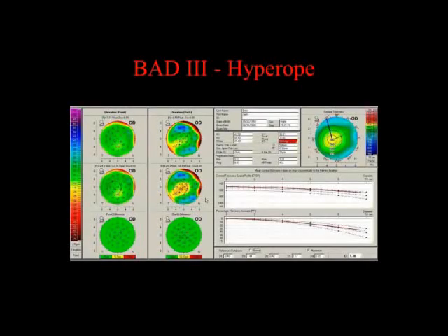So again, you'll notice all these little yellow triangles all over the place. They're actually sometimes even hard to see where they are, but they're all over the place. And they're all over here also. Everything has a drop-down menu.